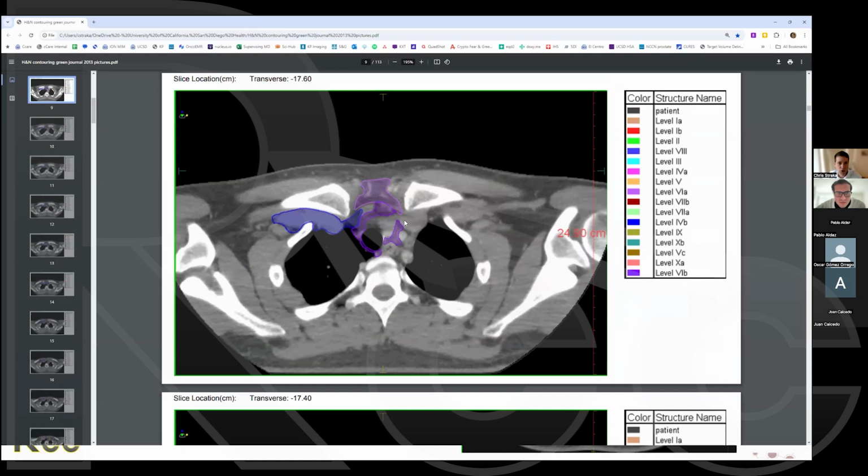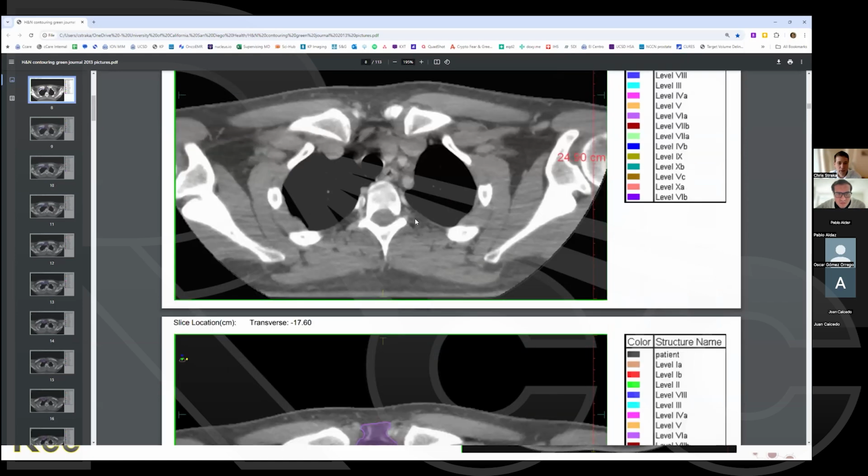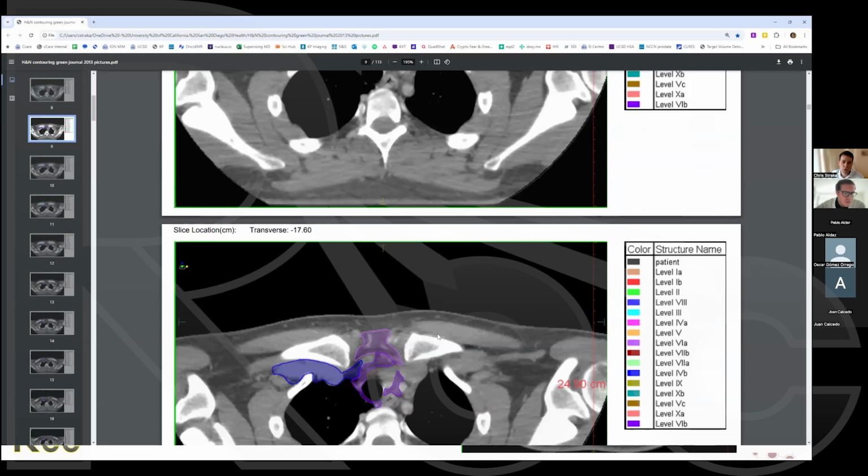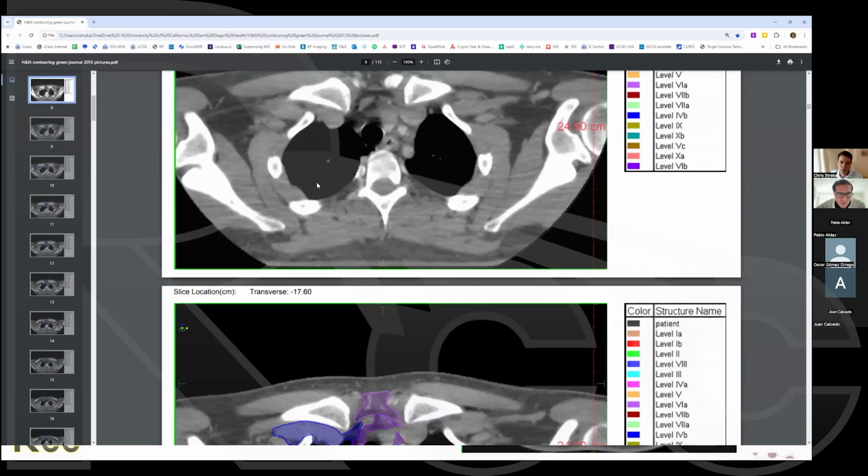And then once we hit the manubrium, the contours do stop. I will note that, on this and other teaching tools, the contours stop at the manubrium. For selected cancers, it can be appropriate to continue the contours more inferiorly. So that would include thyroid cancers. For anaplastic thyroid, we like to go all the way to the carina, so that's much farther inferiorly.